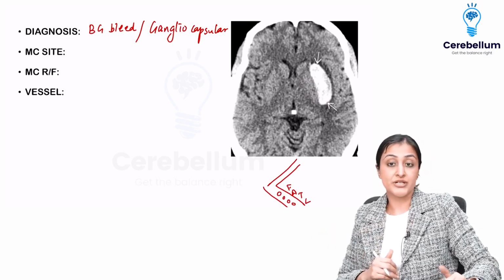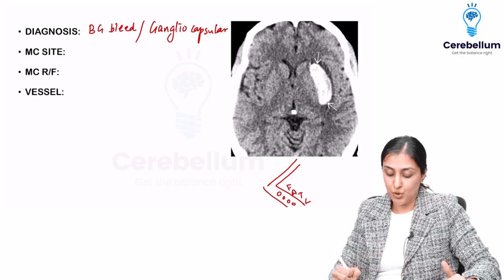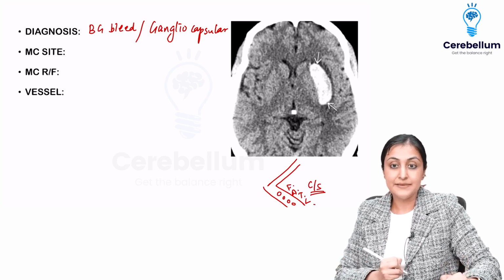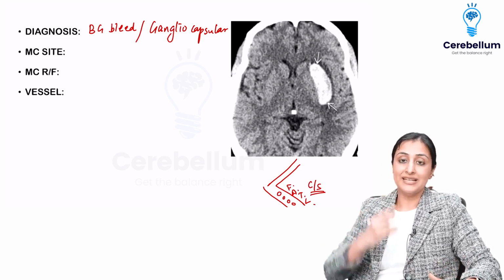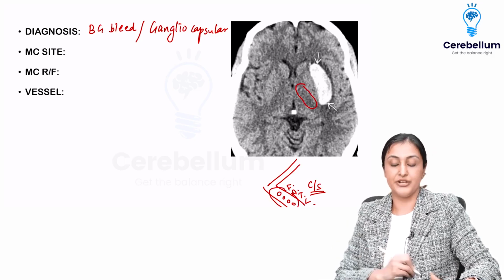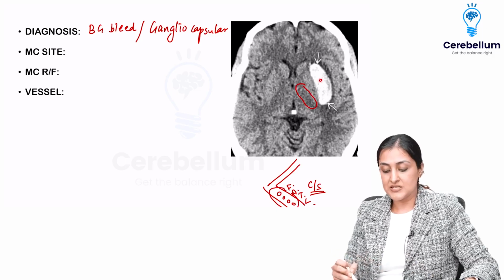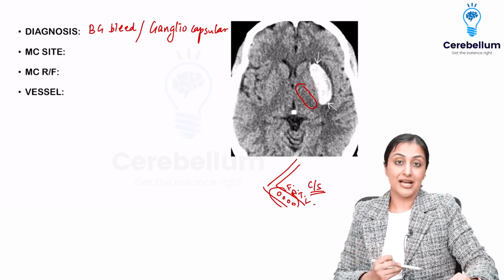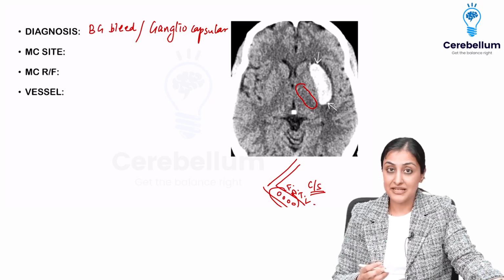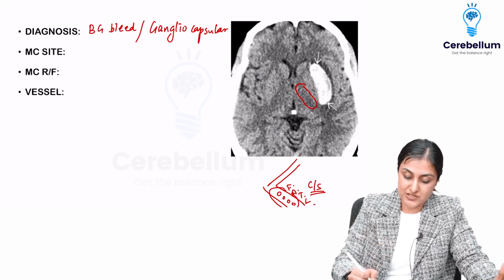This is the arrangement of the internal capsule corticospinal tracts here. So face, arm, thorax and limbs. This is how all the body is in this small area of the posterior limb of the internal capsule. So the moment this gets involved by the bleed, you're going to have hemiplegia. So this is what is called dense hemiplegia. That is how these patients present.